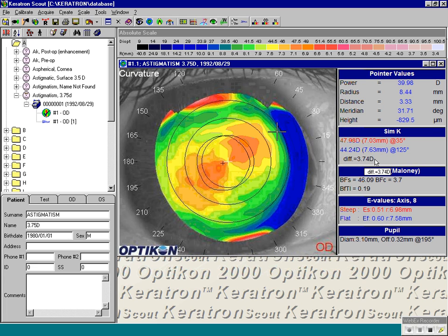On regular corneas, not irregularly shaped, the simulated keratometry will be pretty close to what you would get with optical keratometry. But if there are any anomalies at all within the 3mm section of the cornea, the simulated keratometry may be different from what you would read with an analog optical topographer.